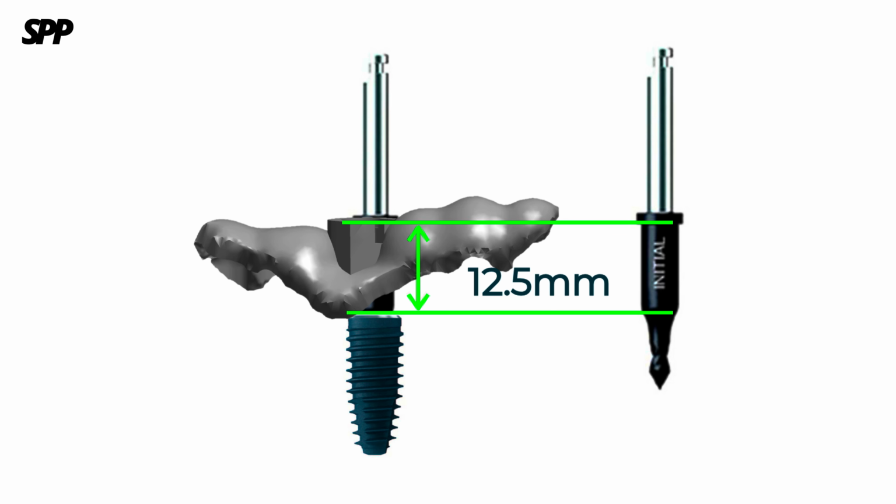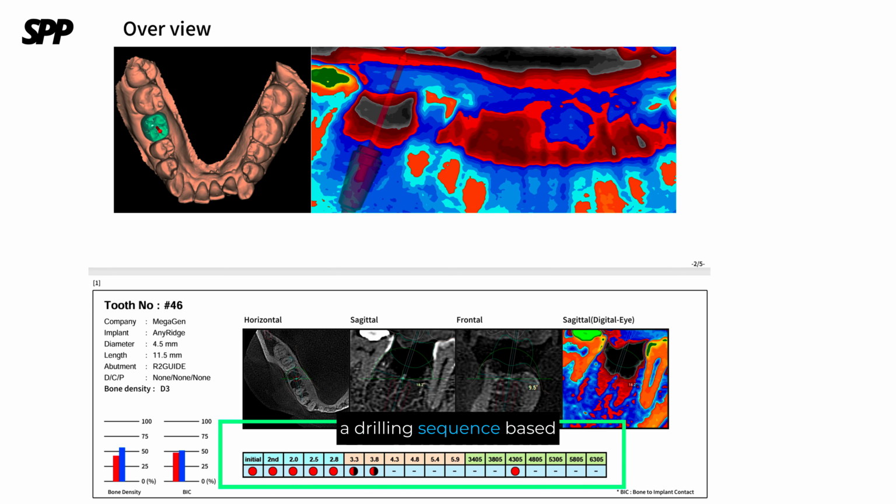After completing the planning, I can export a report. The report also provides a drilling sequence based on bone density. Reviewing this report is very important before surgery.